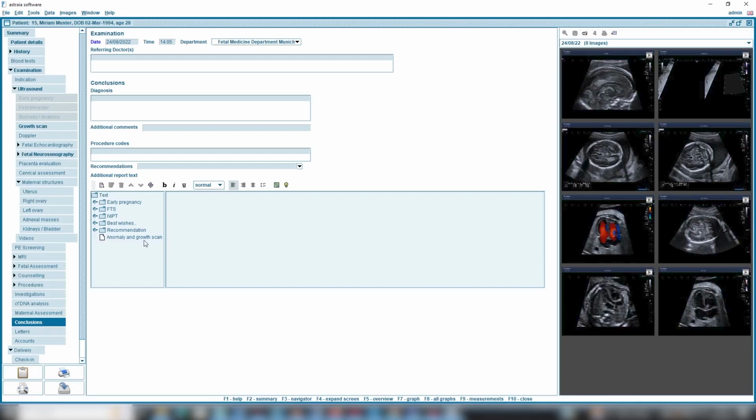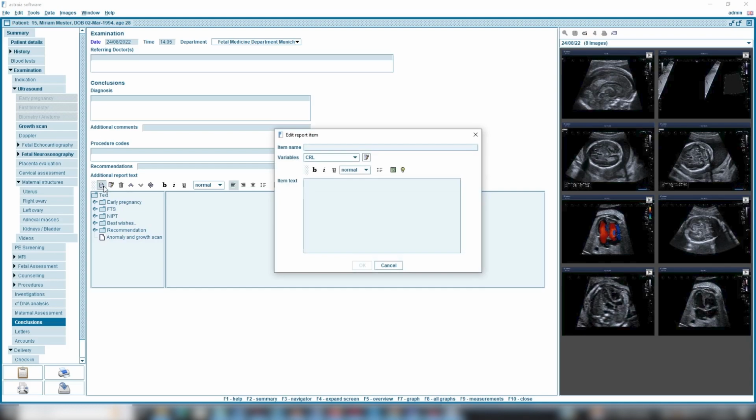The item is currently an empty document, but will be converted to a folder as soon as we add text items to it. Make sure that the folder to be created is selected and click on the Add New Item icon again. Texts can be either written directly in the reporter or transferred from an external document. I personally prefer the second method and will therefore use it in this example.